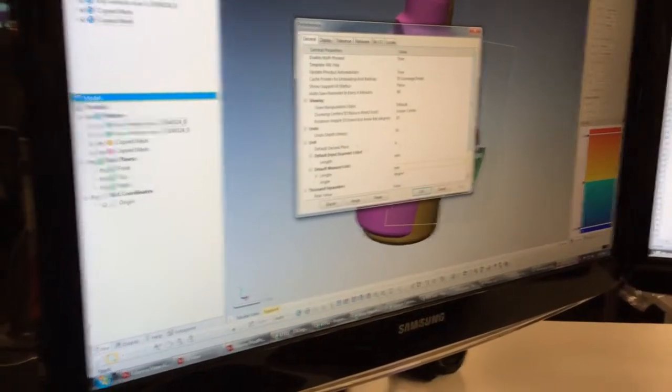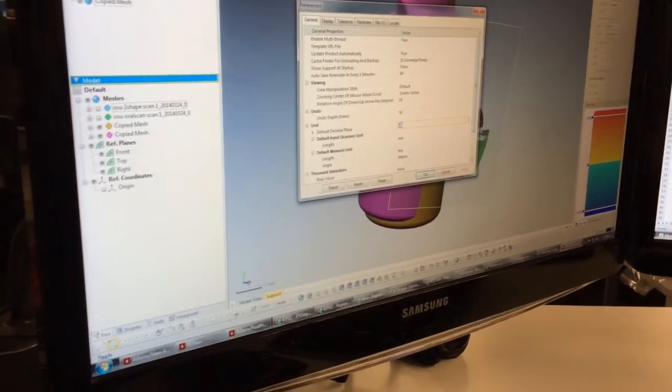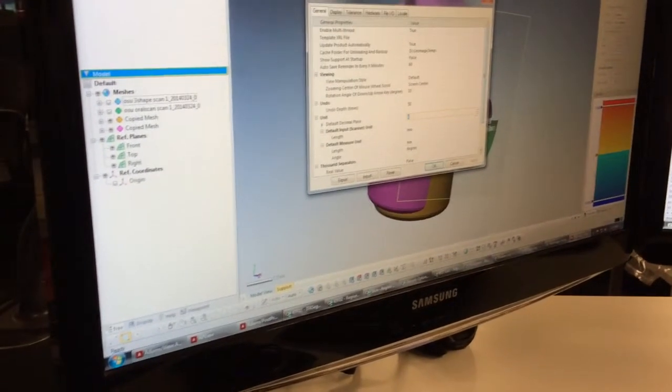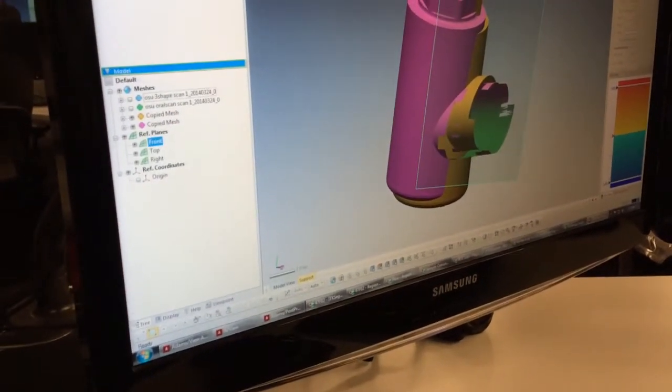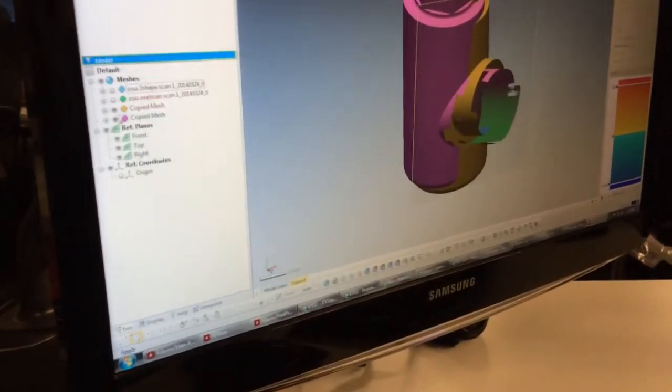No, it is there. Oh, and you can change the default decimal places. So for you, 4 more might not be enough. Yeah, it will be enough. I don't want more numbers than you can deal with.